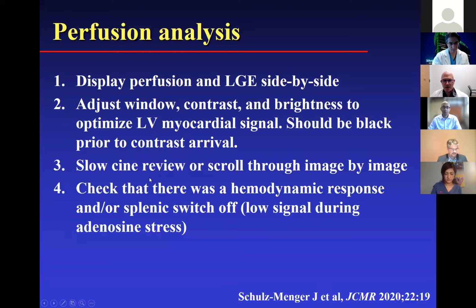So you want to look at it at a very slow speed, or even scroll through the images image by image to really make sure you're not missing a perfusion defect. Because often the perfusion defect may only last 4 or 5 frames before it fills in. So if you look at the images too fast, you may miss a defect.